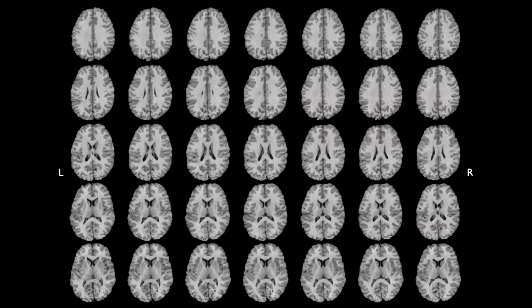These are again the other cuts where you can see the subtle lesion in the posterior quadrant. So you can examine how difficult it is to see the lesion, but how the texture analysis in fact assisted your diagnostic.